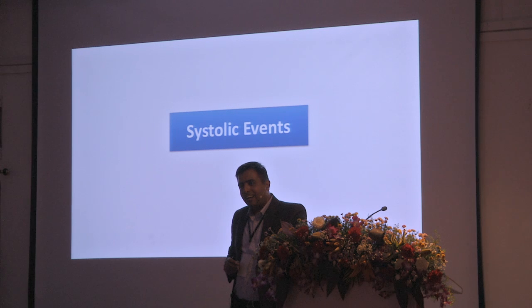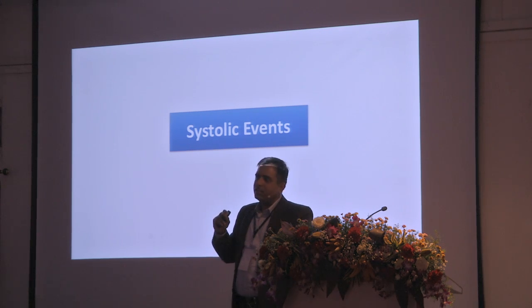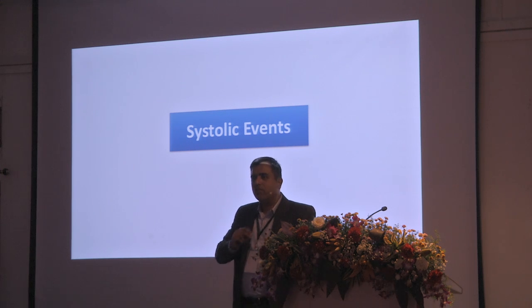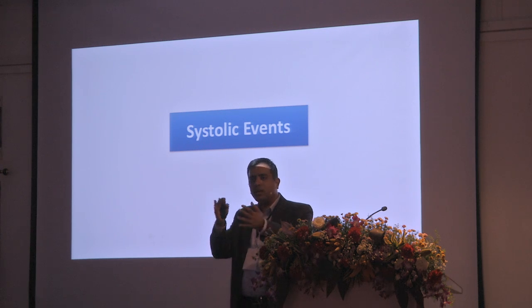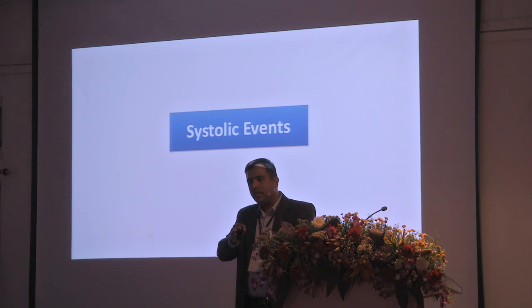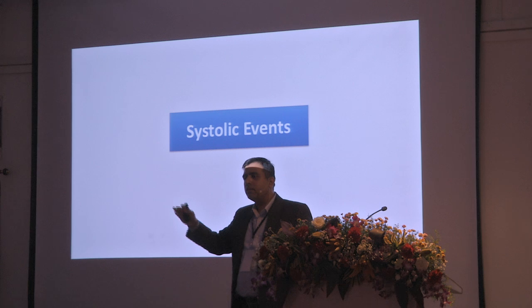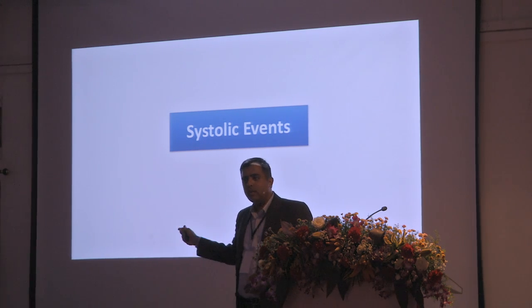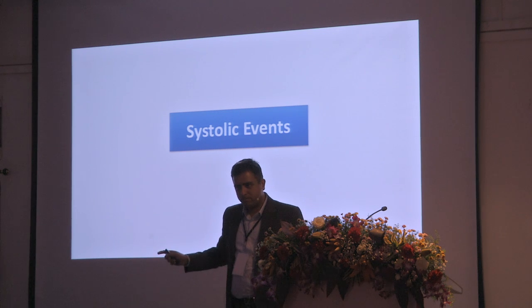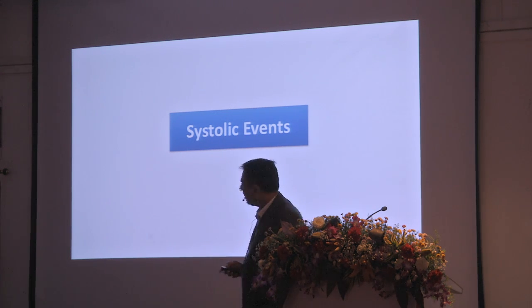So for the next 10 minutes, I'm going to describe the systolic velocities that you are going to see. I hope to be able to describe the systolic velocities to you at different phases of the cardiac cycle, so that you will, A, understand how the heart is working, or myocardial mechanics, and B, apply that to strain and strain rate imaging. So the following is not suitable for viewing by children. I've said that.